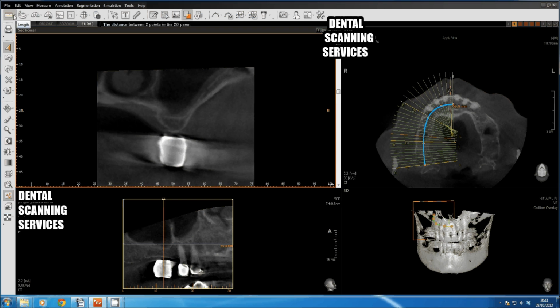So in that situation, we could use any of these measuring tools. We've got a little tape measure here. Click on line. And we can see that we are, if I left click the other way, if we use a flexible measuring device, we are 9.1 millimeters approximately from the crest. Right click and delete, and that gets rid of that.